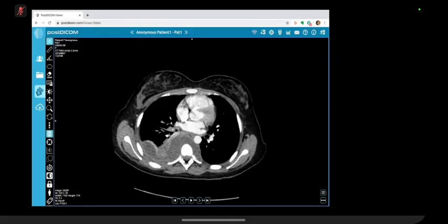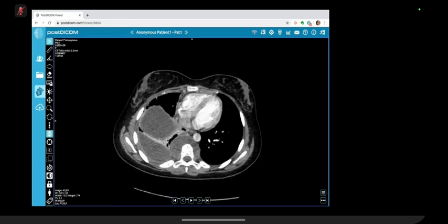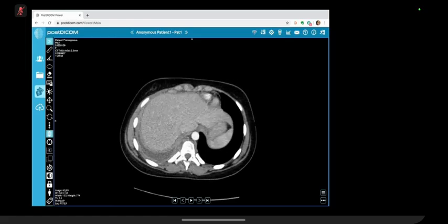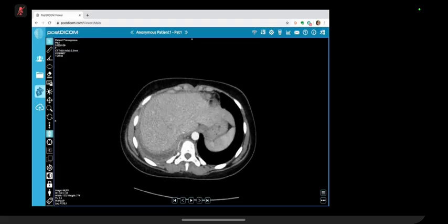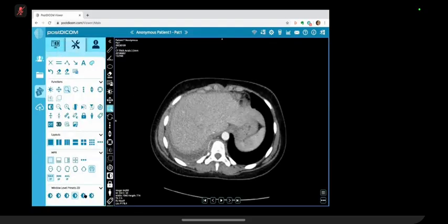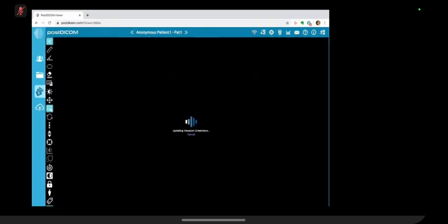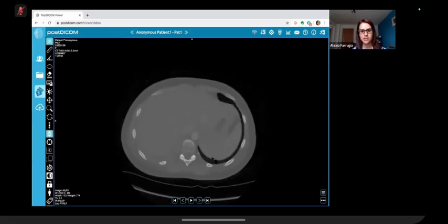I can see abnormal paraspinal tissue, as well as a posterior basal split pleura sign with an enhancing wall. So this is a complication of the pneumonia. It's an empyema. This needs urgent drainage via chest drain or a pigtail insertion. I think this also might be complicated by a paraspinal extension of this pyogenic process. Well done. There's a paravertebral collection, isn't there?